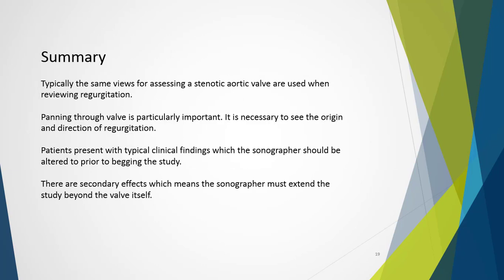In summary, we typically use the same views for assessing the aortic valve and regurgitation as those with stenotic lesions, and that's why we haven't spent too much time moving through the images there. Panning through the valve is particularly important. It is necessary to see the origin and the direction of regurgitation.